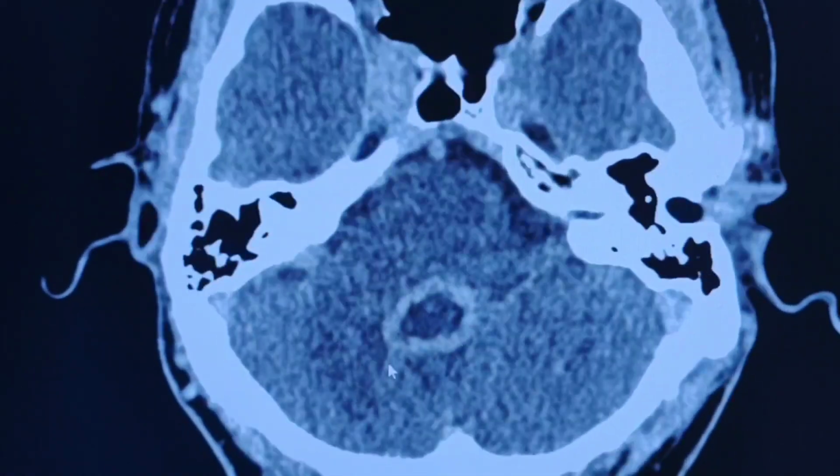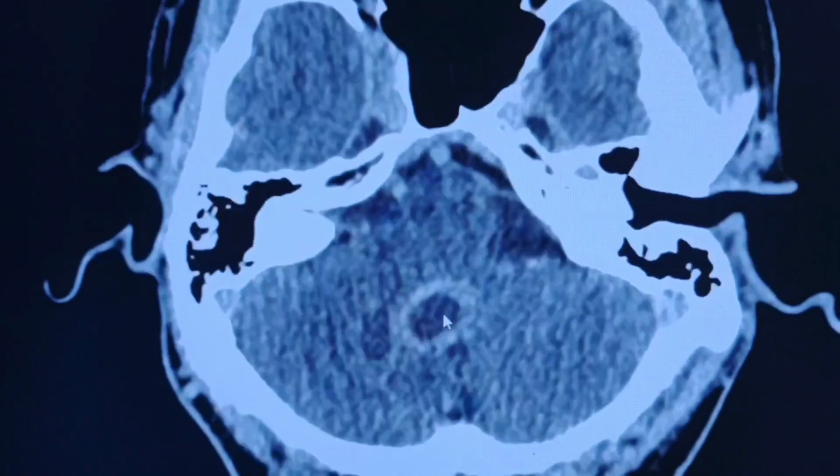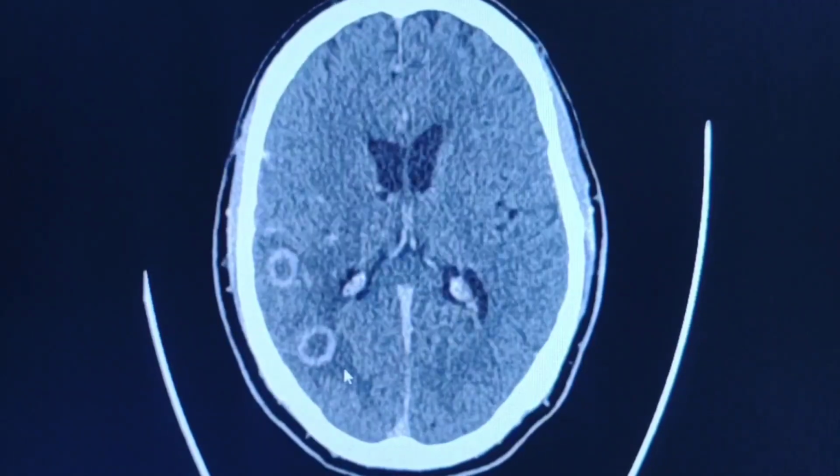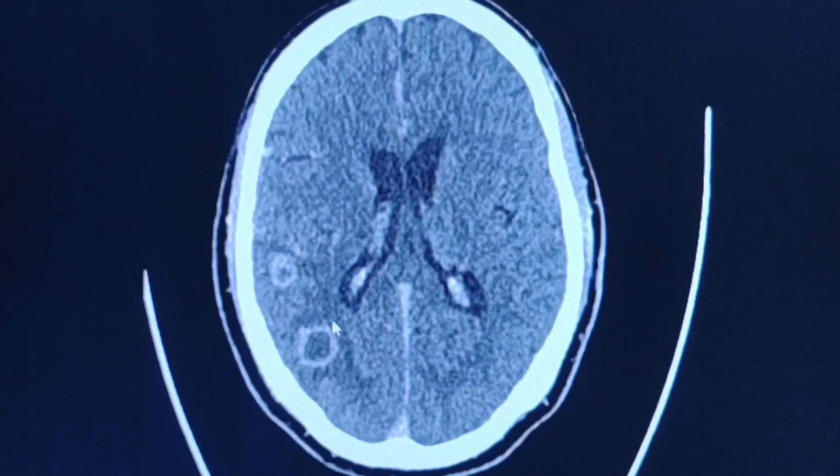We can see that there is enhanced peripheral rim and hypo-attenuating center in the lesion. And I will scroll the images up and down to have a look in these multiple intracranial lesions.